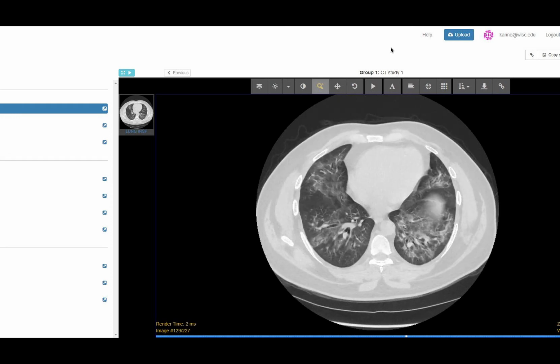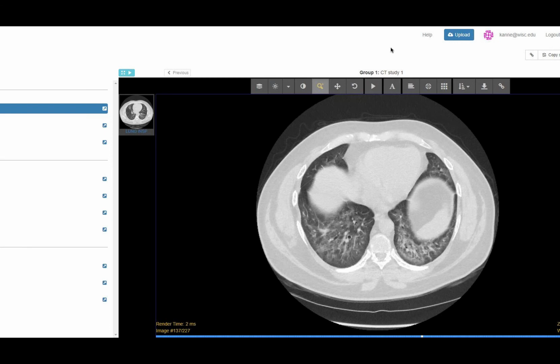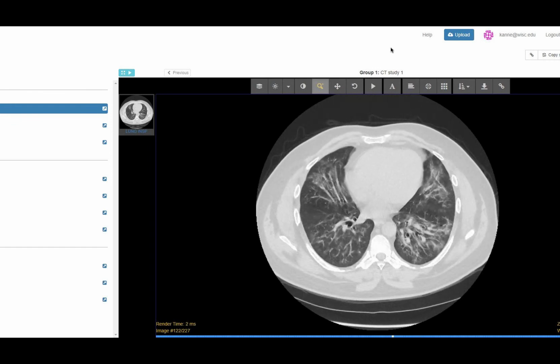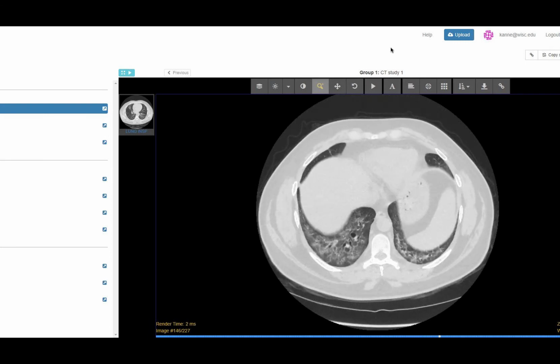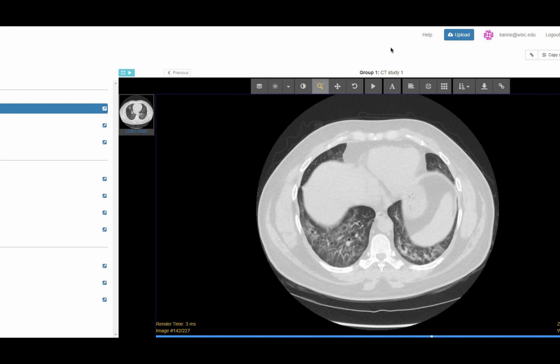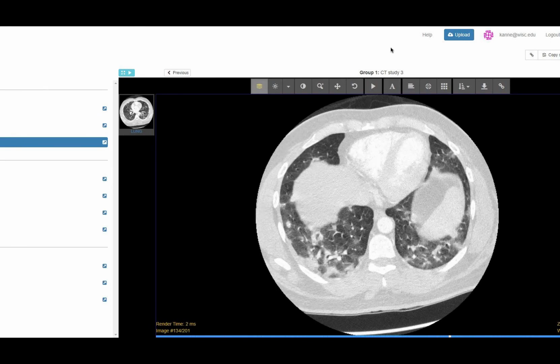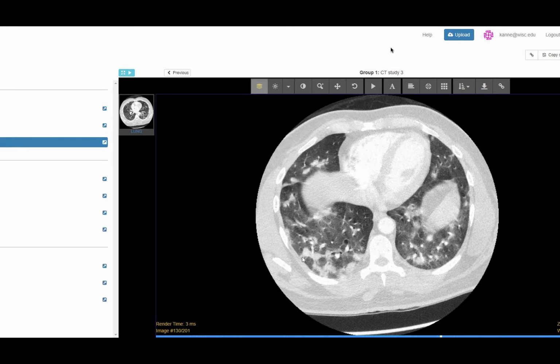But it's not common to see OP with Sjogren's. So I think they're concerned there's maybe an overlap with myositis or something as well, which is not unheard of. If we biopsy, and I have at least one case where we have two biopsies, one when the patient had OP and one when they had NSIP, you can see two different patterns depending on time, but that can help as well. Going back to the original scans, this was the initial presentation, and that's why I'd wonder about myositis, because it commonly will present with OP rather than showing up with fibrosis.